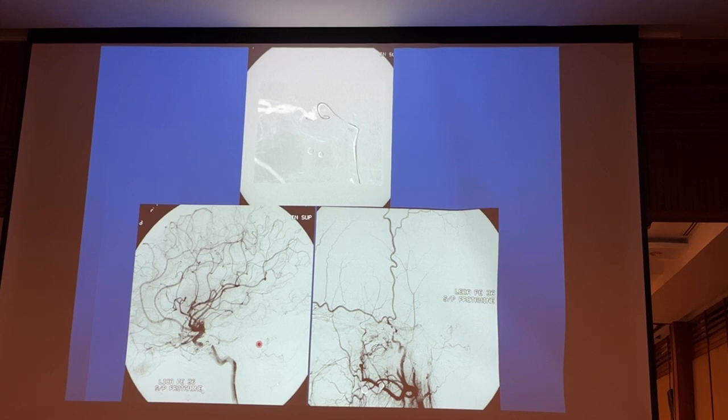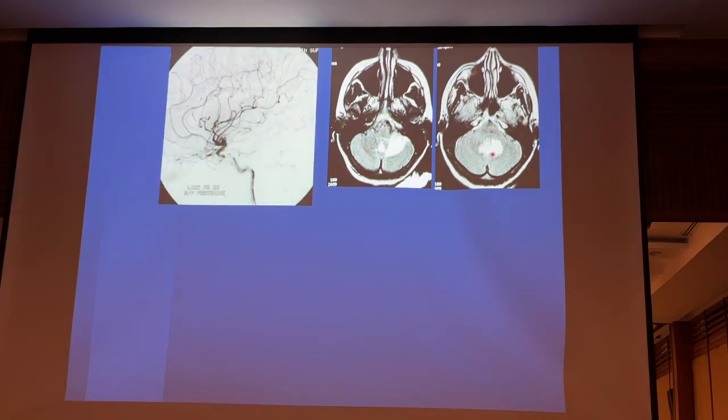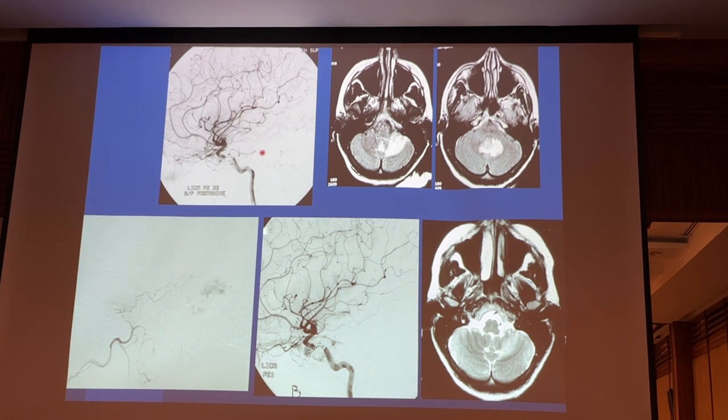However, the patient had severe dizziness, nausea and vomiting the next day, and we did an MRI. MRI shows ischemic changes of the cerebellum and vermis. An angiogram shows this little bit of remaining part is causing venous hypertension in the cerebellum through this petrosal vein, which is draining this portion of the cerebellum.